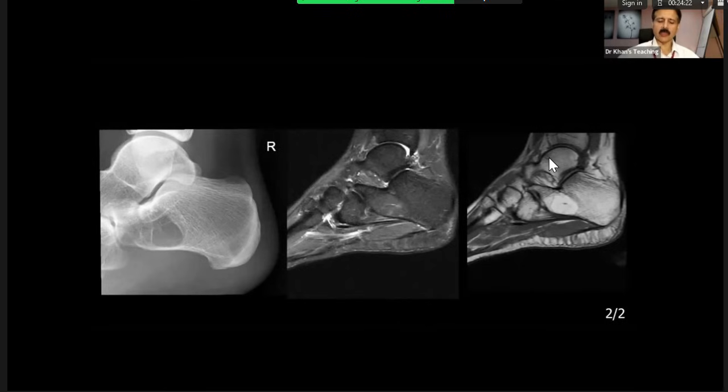It all depends on the age group. So in here you are a bit handicapped, but you feel that this is not a child. So chondroblastoma can occur there, and in a slightly advanced age group, not advanced, middle age, it can be a giant cell tumor. It can be a lipoma, as you have pointed out.